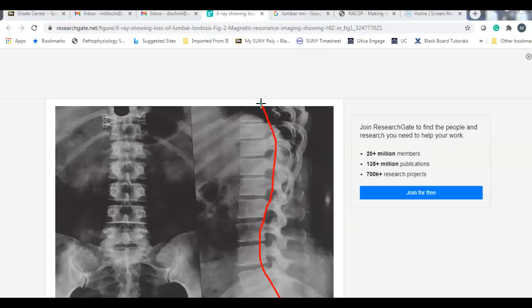Okay, those are the normal curves that you'll see on that lateral film, as opposed to the A to P or P to A. Generally, if you're doing the spine, you want the spine up against the bucky where the x-ray film is. That should be straight. If we get a curve on that A to P film, it would be indicative of a scoliosis.